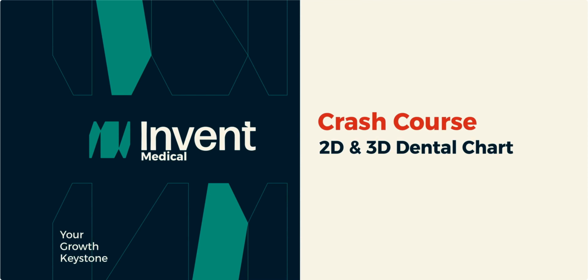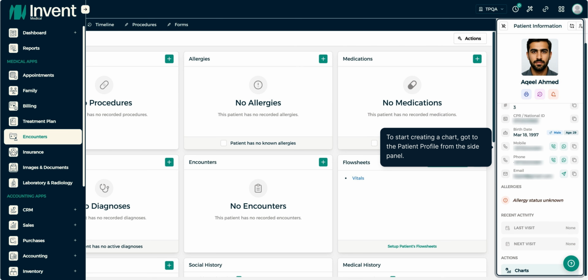Welcome to Invent Medical's crash course on the 2D and 3D dental chart module. In this video, we'll walk through a general overview of the module, how to select and mark teeth, add treatment procedures, and more. To start creating a chart, first go to the patient profile on the side of any module.